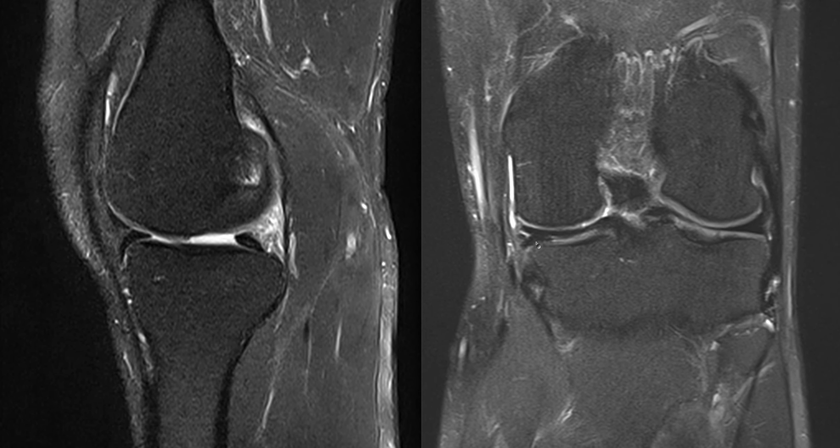So look very carefully for morphological abnormalities of the meniscus. And when you find them, look very carefully in the posterior joint and in the medial and lateral recesses for small meniscal flaps, because they're important lesions to find, generally easy lesions to treat, and very satisfying for both clinician and patient.